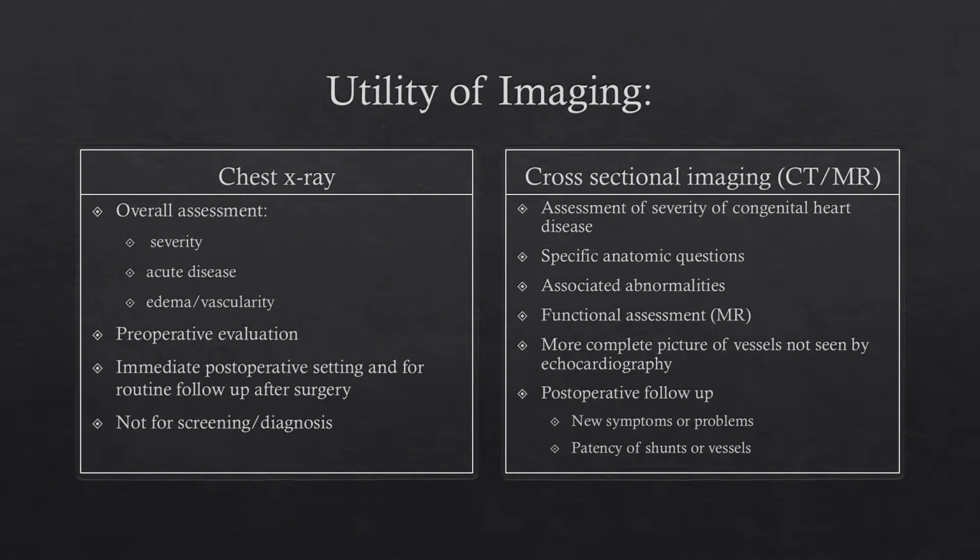So what is the use of the chest X-ray in pediatric heart disease? It can be useful as a general overview of how severe a process is, or whether there is an acute change such as pulmonary edema. It is used for preoperative evaluation and in the immediate postoperative time period, as well as for routine follow-up and for assessment of major changes. But it is not typically used for screening or to make a specific diagnosis, which is done by echocardiography.